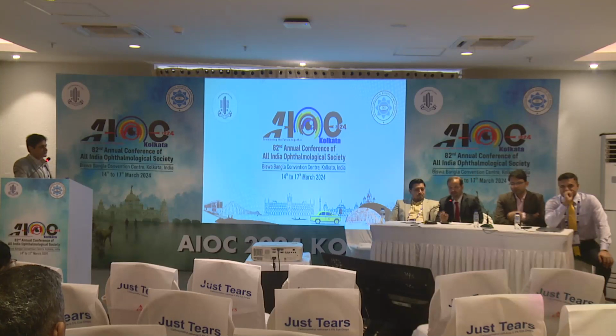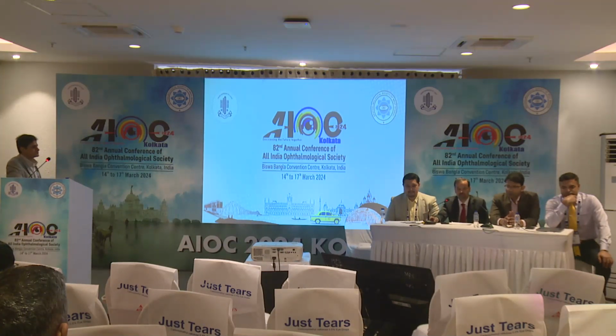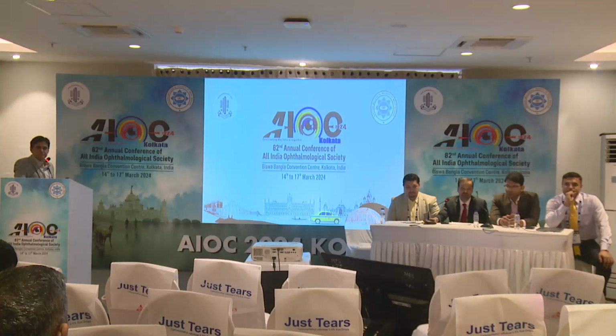There was a time, for a very short period, we were not doing it, but I think if you routinely start doing ICGA, even in today's scenario, you will find at least 20 to 30% of the lesions are outside the FAZ. So even if they're in the macula, you can directly laser them. So even in today's scenario, it's very important that you do ICGs in all these patients. Once you start monotherapy, it's a never-ending game. It looks very nice, but patients virtually are always on anti-VEGF therapy. But once you laser the polyps, the BVN part is very easy to tackle. So it's important to find the polyps even now. I think 30% of the lesions, those 30% of patients, do not require repeated anti-VEGFs if you knock away the polyps.